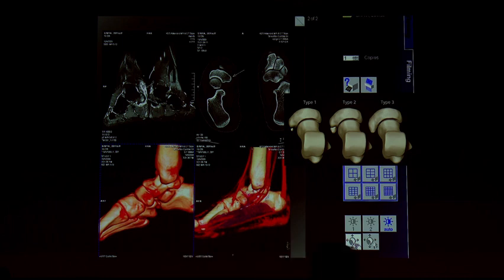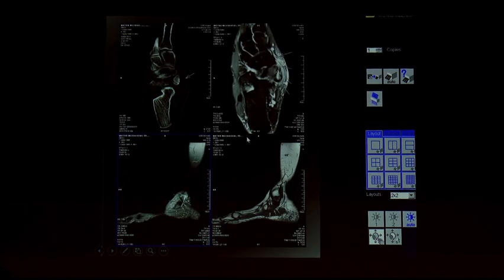changes or pain, we have to carefully look for what is happening with the navicular. This is classical appearance of type 3 navicular, where you can see the navicular is a cornuate appearance, very large, where it will go for signal changes. You can see the continuous irritation of the tibialis posterior tendon with the signal changes, and this is classical appearance of type 3 accessory navicular.